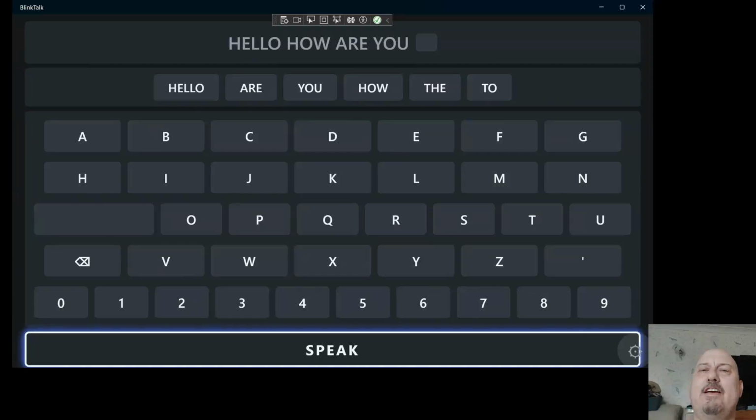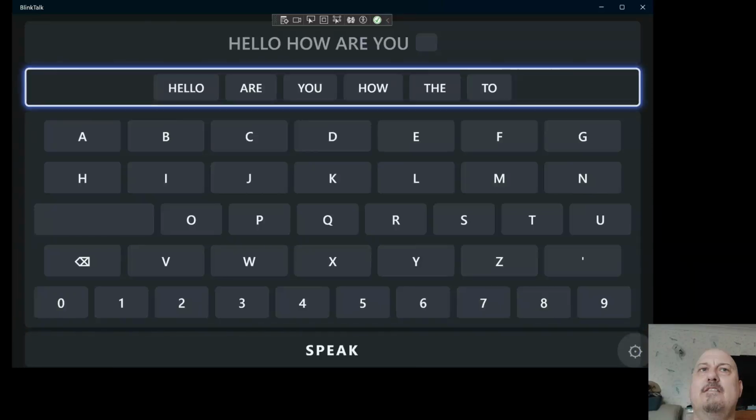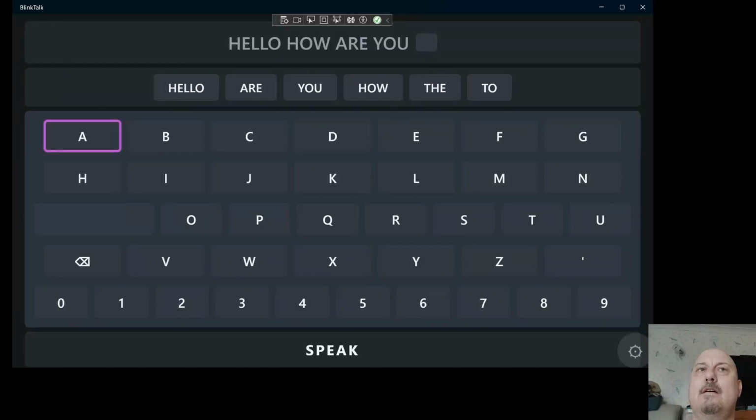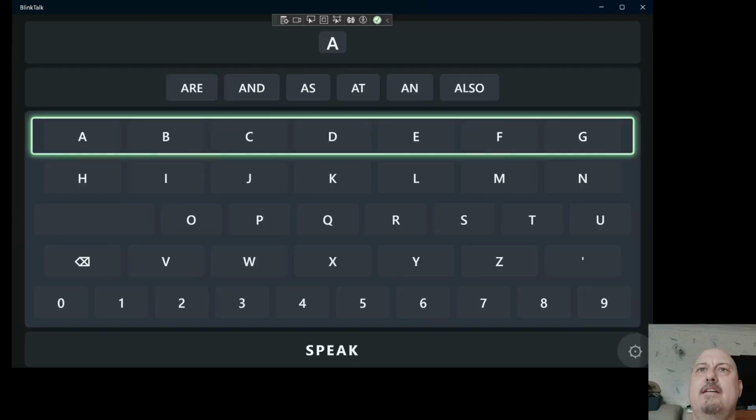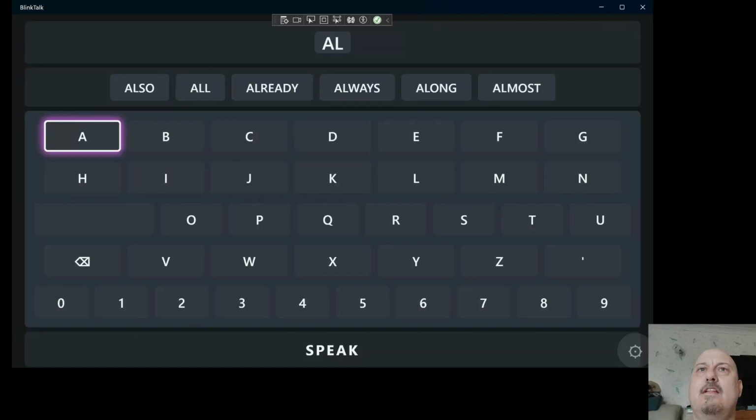Let's say I've got an Alexa Home Assistant. Now, as I say, because this is the first time I've ever used this, it's going to be slow for me to type it in the first time.